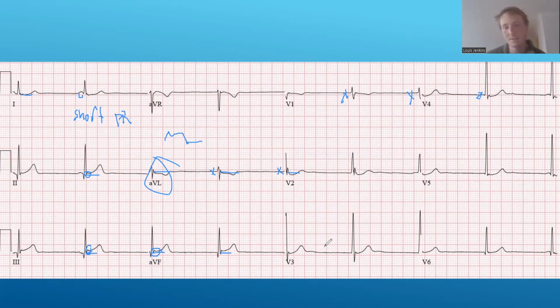It's over all of my drawing because I made an absolute mess of this ECG. But J-point notching is one of those things that generally we associate with benign early repolarization. And I think with this ECG, there could be a temptation to see that notching, see that ST elevation, and be quite dismissive of it as BER.